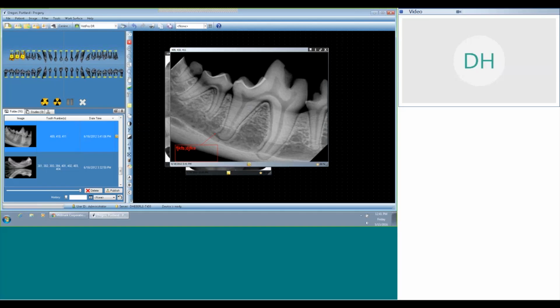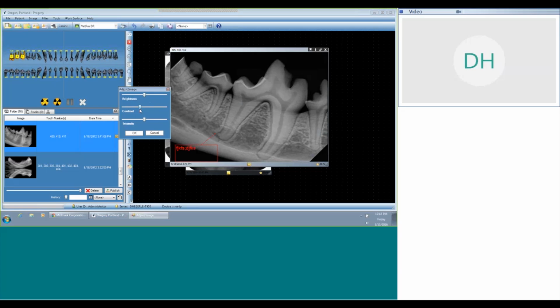So as we're talking about filters, we can go down through here. Our next little tools have the contrast adjustment to them. So there's 3 different options here for that. The half and half here provides a slide bar for brightness, contrast, and intensity, where you can come through here, holding your left click and just kind of sliding those different levers over to enhance your image.